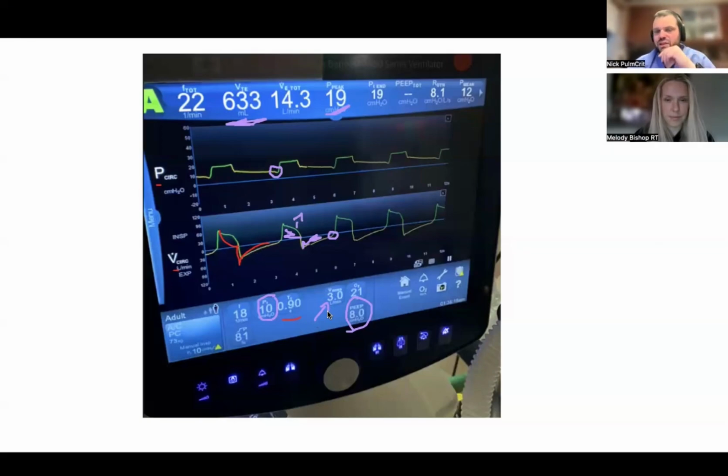So, whatever, you take that into account. But a big reason why patients have delayed trigger is auto peep. So signs of auto peep, certainly. It's a pretty big breath for not that much pressure change. So that essentially means that the compliance is good.